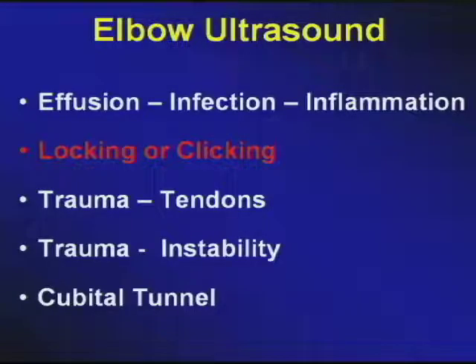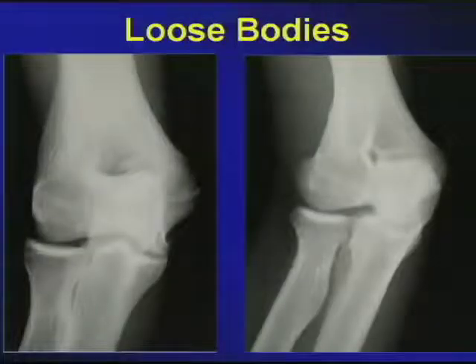After the effusive joint, one of the more common complaints about the elbow is some locking or some funny kind of clicking. Radiographs are sometimes helpful, but you must know where to look for these loose bodies, which are often the cause of clicking or, like we said, locking. Here you could see in the olecranon fossa two radiopacities, round in form and contour, that may represent loose bodies. Likewise, try not to forget that the annular recess is also an area that may contain some loose bodies.